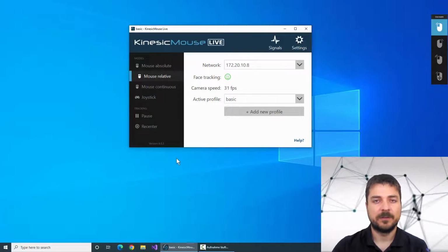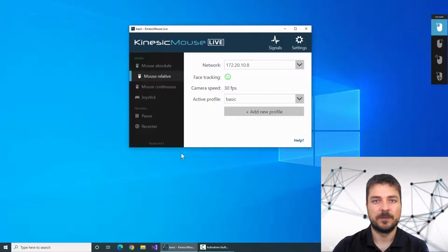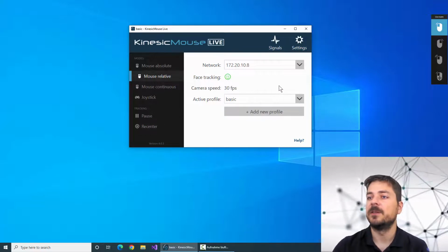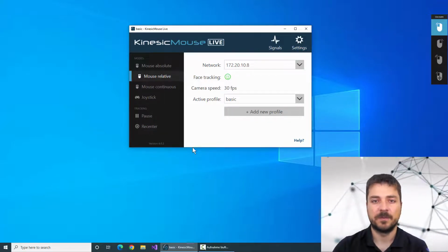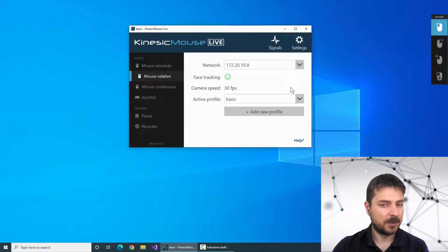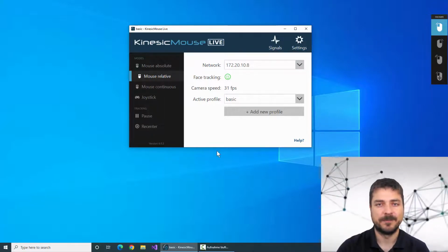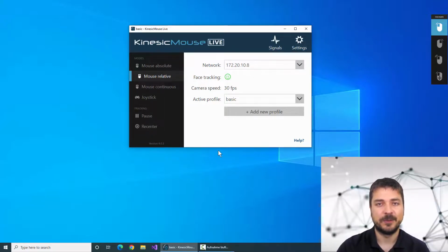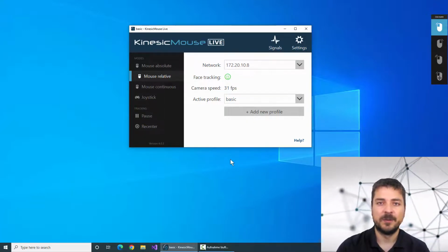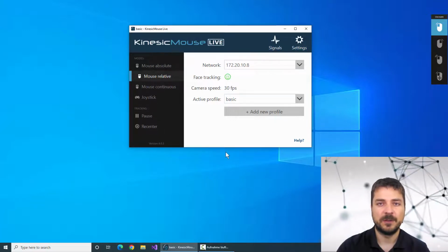So what this does is you can reach any place on the screen while also using a fairly slow mouse pointer speed. For example, if I want to reach the top right edge of my screen, you can see I cannot reach it with my head rotation. So what I can do is I rotate upwards, block the mouse cursor from moving, and then do the rest of the rotation. This signal to suppress the mouse pointer movement can be compared to lifting up the mouse from your desk, moving it to another location, and then continuing on with the directional movement of the mouse.